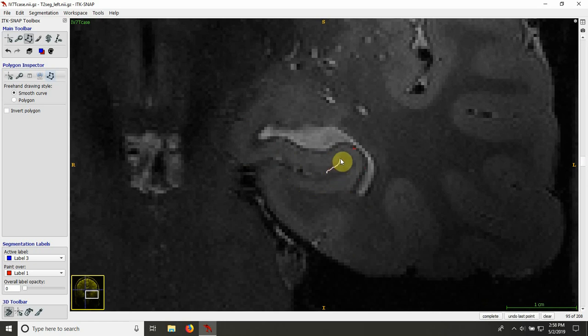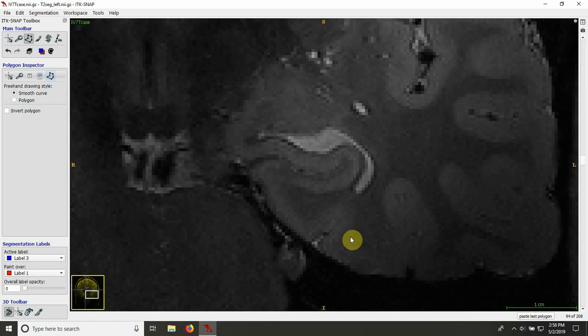And I think dentate gyrus is probably only this portion. And then going one slice further anterior, I don't think there's anything left. You can see the hippocampal sulcus and the dark band here, but I don't think there's any space for dentate gyrus voxels in the middle.